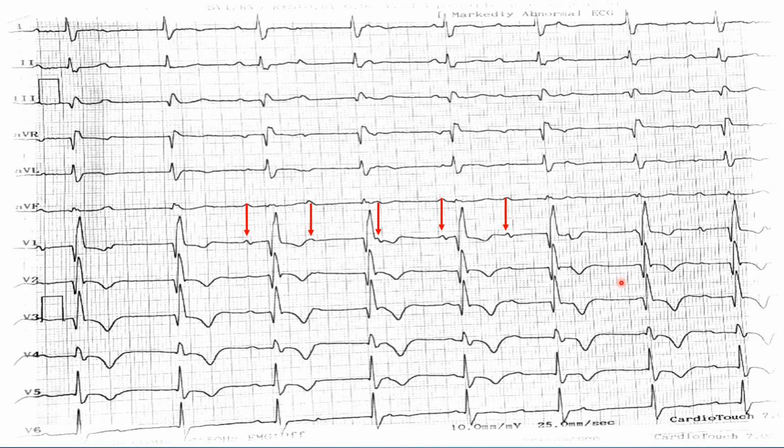First of all, for that, we have to identify the P waves. Now we can clearly see P waves at some points, and we have to identify and take them out. I have marked these P waves with the arrows to make it easier to understand. These P waves are pretty much on time, so there is no variation in the PP interval. The rate for this gentleman was 88 beats per minute, and this is something important when we discuss the ventricular rate.